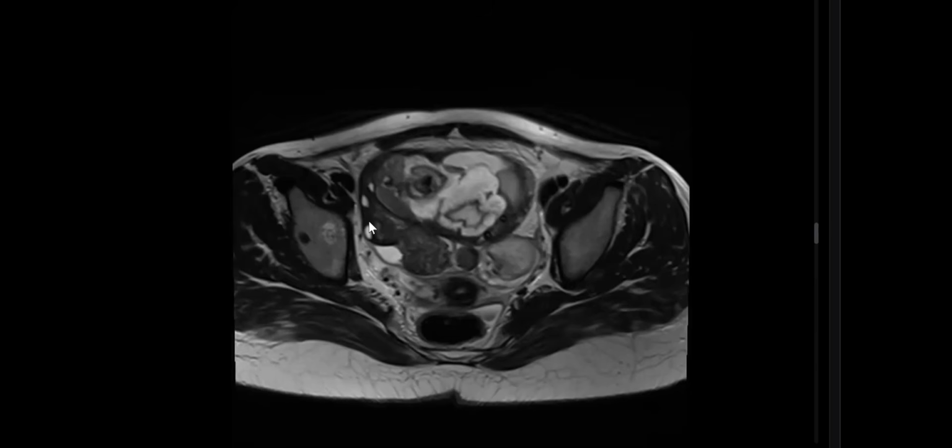It is enlarged with low signal peripherally, which could represent a chronic process, or it has undergone somewhat ischemia. Can you determine the nature of the ovarian lesion? This could represent an ovarian dermoid. How to confirm from a single sequence? We need fat-saturated sequences for confirmation.